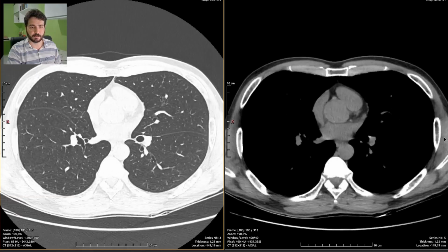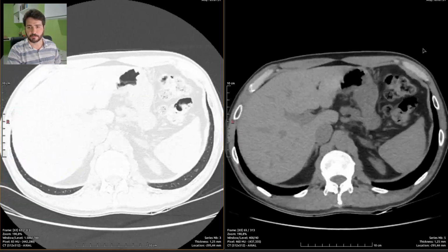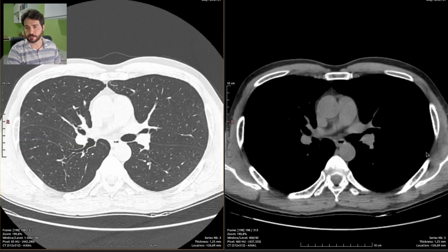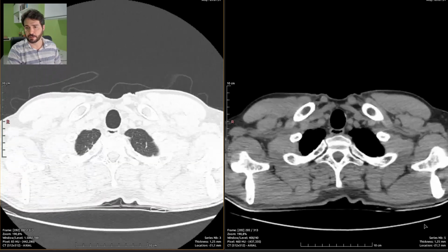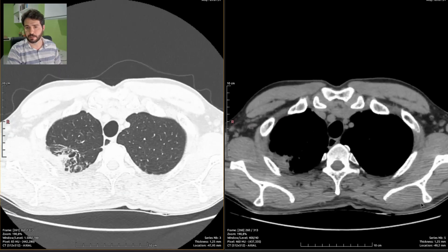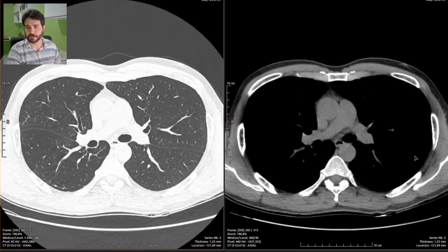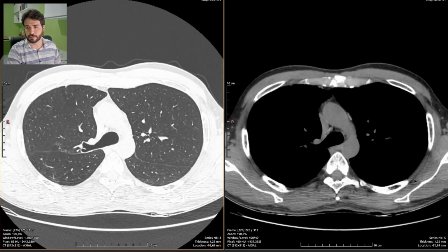This is extremely common in tuberculosis patients. This patient was lucky because he actually has very little scarring of the lungs. It's usually much more severe than that. Okay.